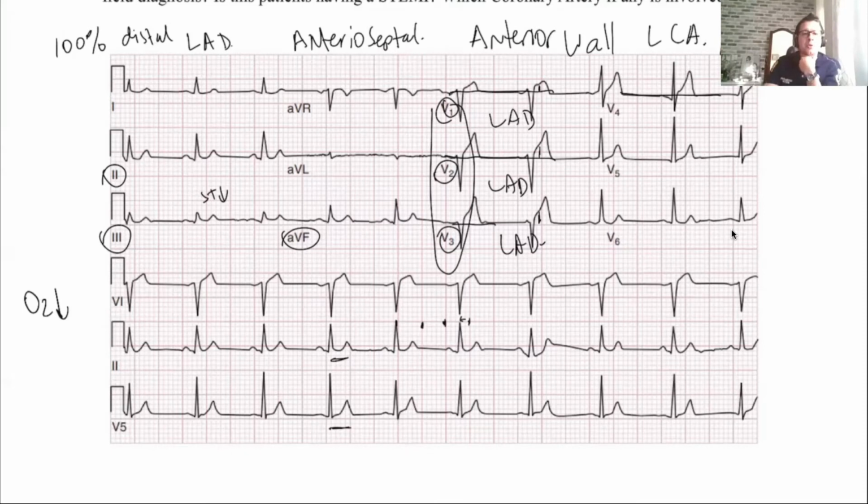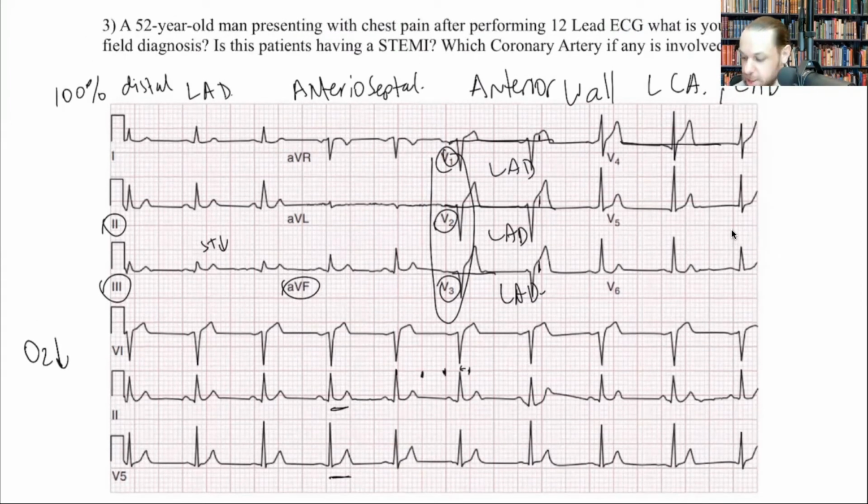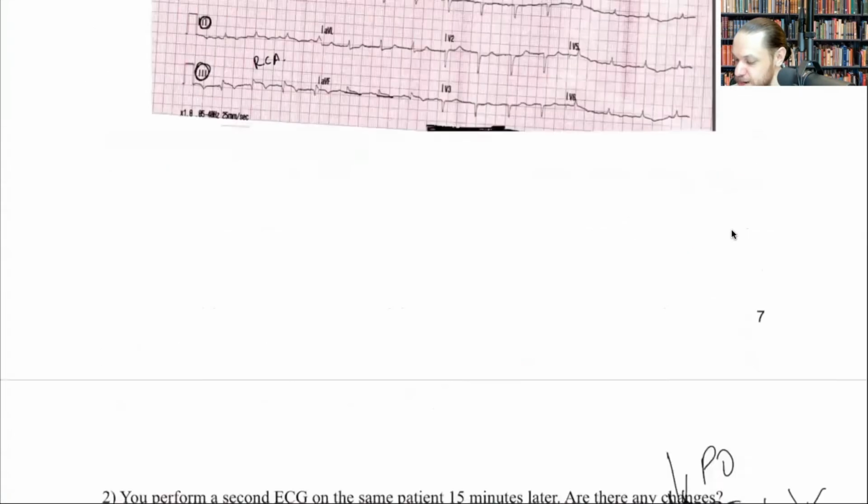Nick, yeah. So you mentioned here, I think you said you would suspect reciprocal findings in 2, 3, and aVF. Yes. Why reciprocal? Why not elevations? Because if you had elevations, then there would be a possibility that this person is having both vessels infarcted. So what you're saying, Milan, is this: let's say he had elevations here, right? Here, right? Can you have elevations here and here?